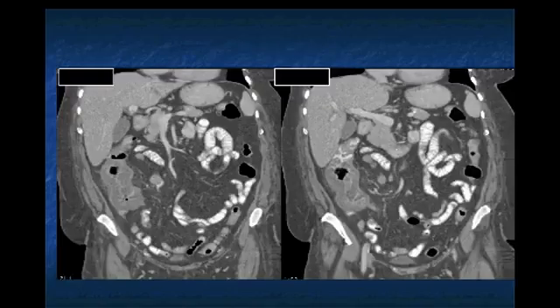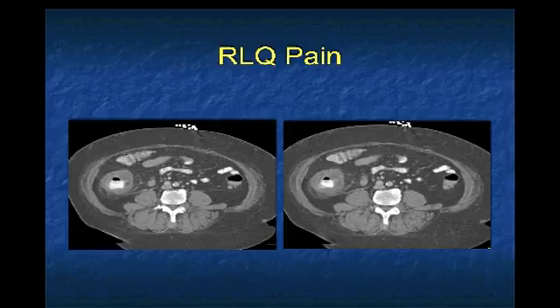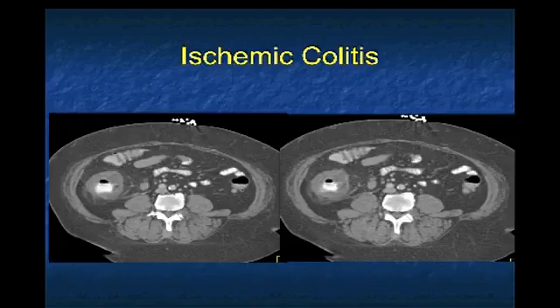But you know what happens sometimes, and IBD would be a good thought, colon cancer, this appearance, this circular appearance with thickening, and there's a node there, can also be seen in ischemia. This was an unusual case of ischemic bowel, ischemic colitis. Prominent circumferential thickening. Got to think about ischemic colitis.